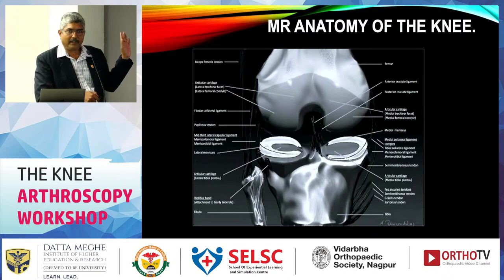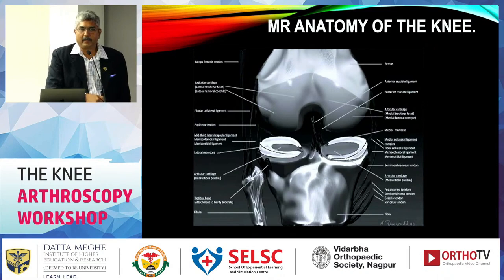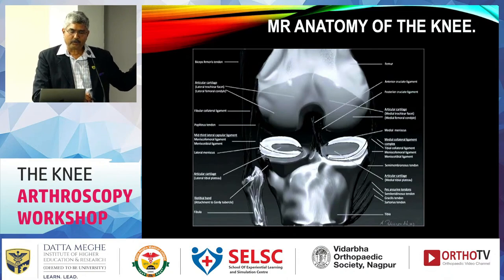One is biceps femoris, which is on the posterior aspect, and another is the deeply situated popliteus muscle. Then 2 ligamentous or fibrous tissues. One is the lateral collateral ligament, and not to forget the anterior part, that is the iliotibial tract. So just keep it simple. Other things are also there, but most of the things are in 2 and 4. So 4 things are here.